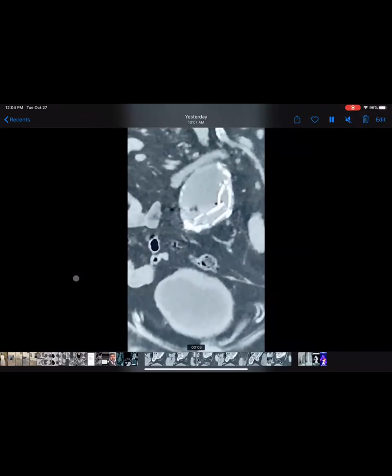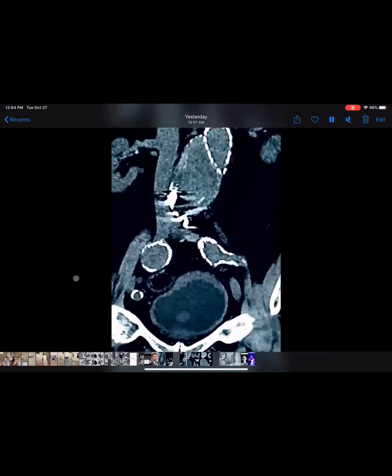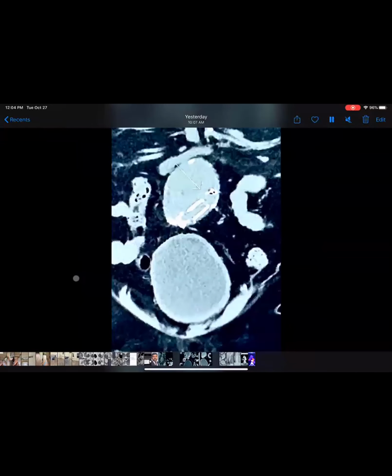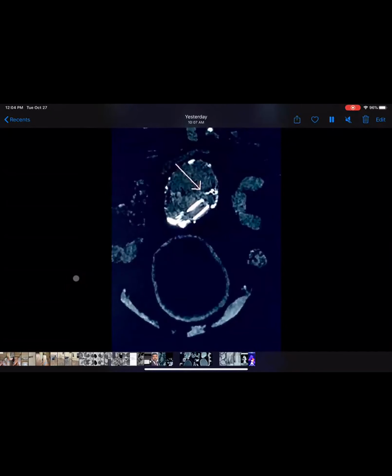it was like this. So basically it was type 3 endoleak, and it was pretty scary. And that's actual. So the size was a little bit bigger, and then that's that disconnection. See, that's the area. I don't know if it's the window level. So I try to window it in a way that you can see it. And you can see the blood is kind of coming out.